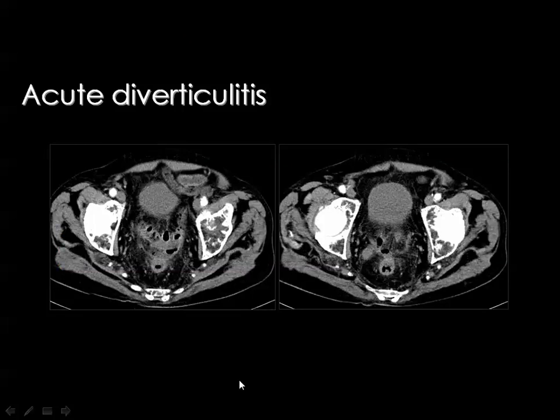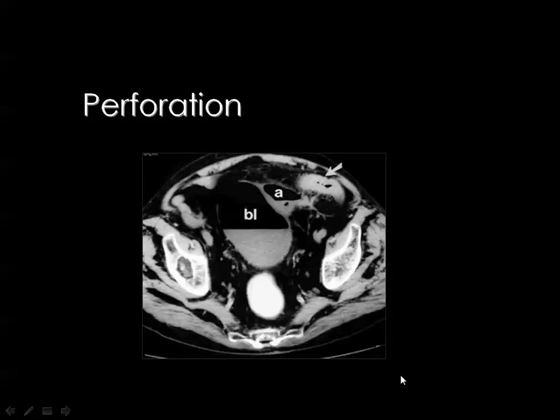Then also this is a case of diverticulitis of the sigmoid colon. Colonic diverticuli filled with air, thickened colonic wall, reticulated pericolic fat. The three items are present. They are essential for the diagnosis of colonic diverticulitis.